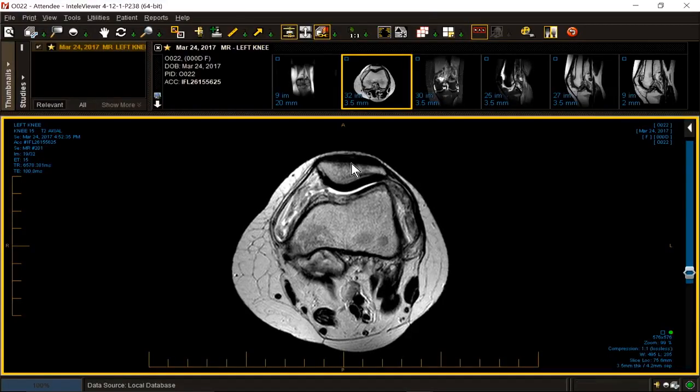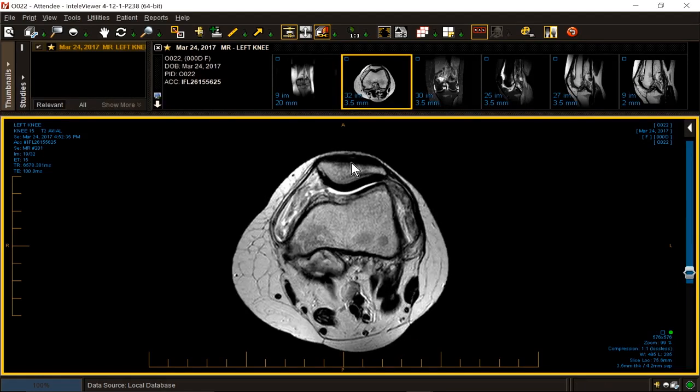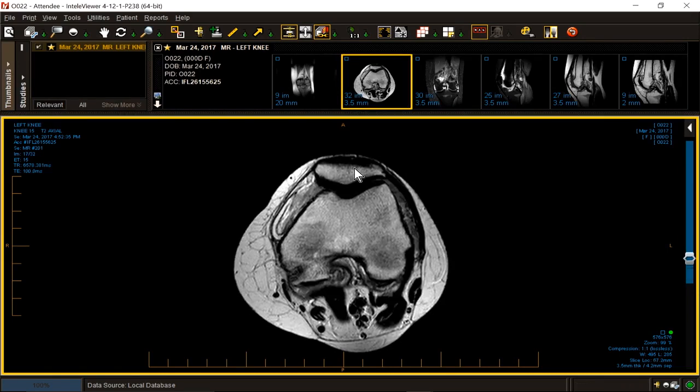When you come back, we'll talk a little bit more about JIA and arthritic conditions, and I'll have a few classification systems for you. Take a break. We'll get few other chances to cover arthritis with such alacrity and such a grotesque example of it, with tremendous pannus in this young woman. Younger individuals, especially those between the ages of, say, 12 and 25 who do have inflammatory arthritides, tend to be more seronegative.